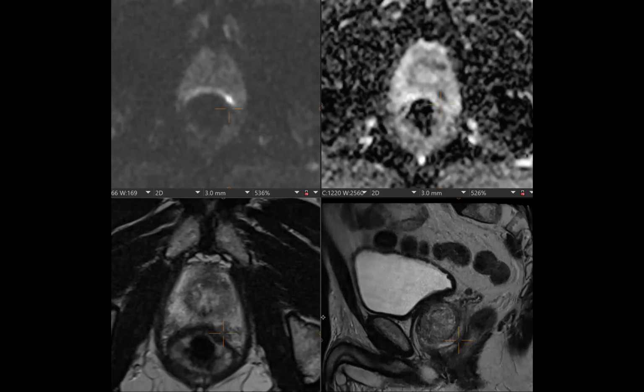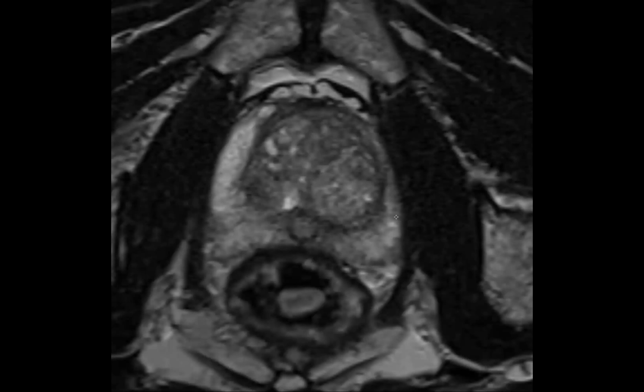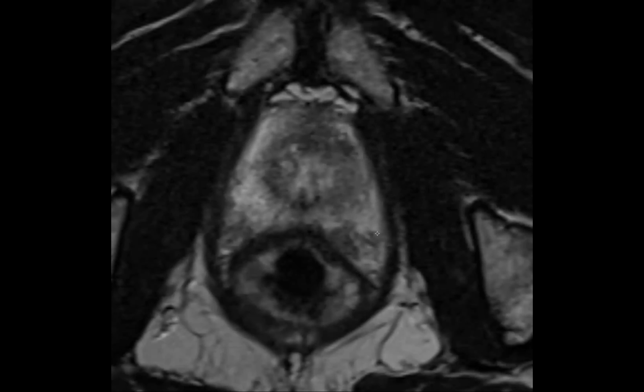Yeah. The prostate, I'll tell you that the way they acquired it, this was an outside interpretation. It was like directly axial. I don't know if we're supposed to do it, but it's not orthogonal to the longitudinal axis of the prostate, just like we do uterus and things like that. Okay, I'm changing my mind on that right there posteriorly, like there's a little tongue going backwards. Yes, this thing. So there's the peripheral gland, and then maybe the peripheral gland ends here, and then there's that tongue of T2 signal.